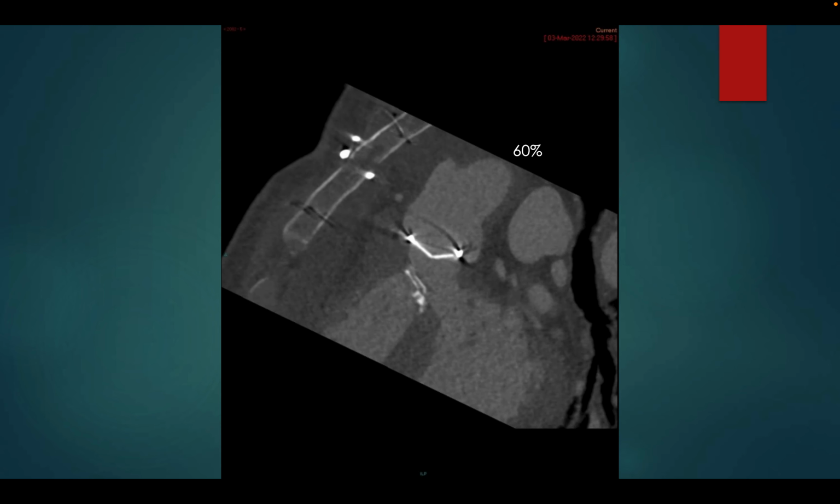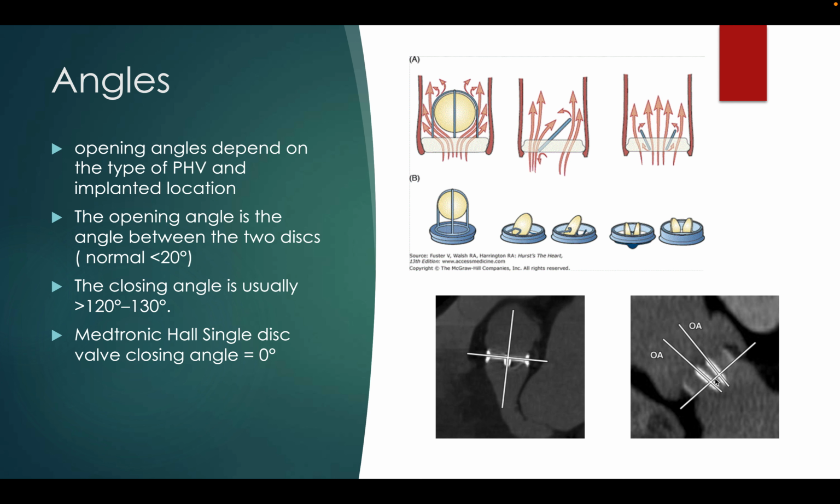How to measure the angles. Those are the bi-leaflets that we saw in the images. This is the horizontal plane, and here are the axes which go through the leaflets themselves, and we're going to use this angle, and when it's closed we could use those two angles.